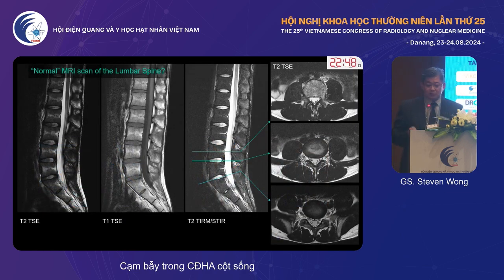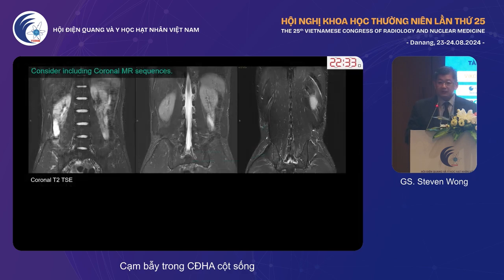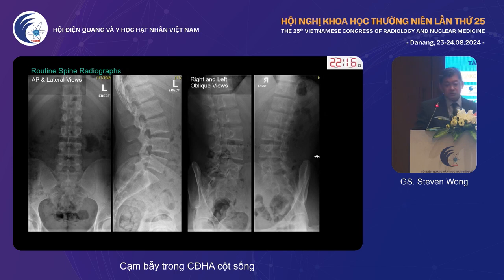This is what a normal MR spine should look like. In my hospital, we use a sagittal T2, T1, and STIR. And this is what the axial should look like at different levels as well. If you can, especially for scoliotic spine, do a coronal T2 sequence. Some hospitals like T1s. I have no problems with that, but I like T2s so that you can look at the nerve roots as they come down the spinal canal and as they exit the spinal canal. The coronals also help you look for places where there's muscular trauma in the paravertebral and paraspinal muscles.